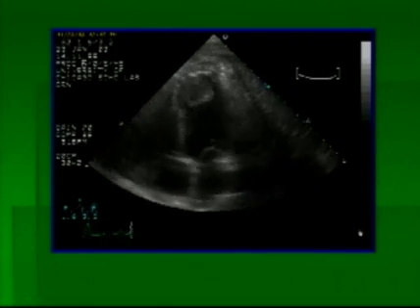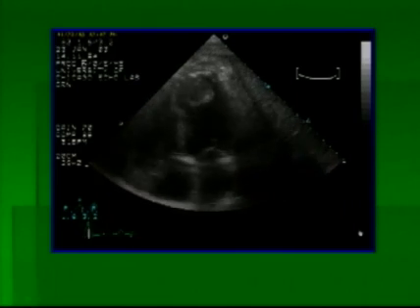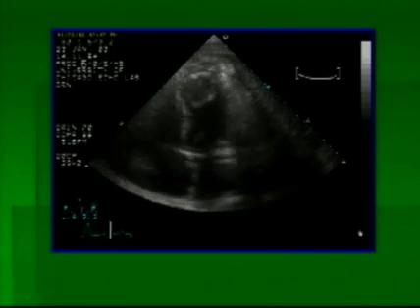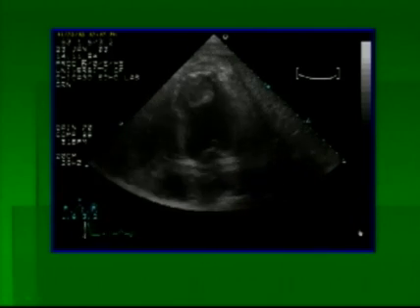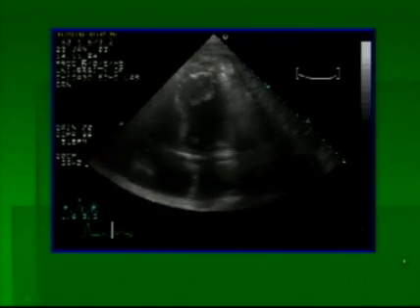So to tell you the way I would look at this, in the left ventricular apex, there is a very large mass. It's accompanied by a wall motion abnormality. In fact, I would characterize it as akinesis of the apex with some brightness in the myocardium and probable thinning. This mass is not terribly well circumscribed, and it is partially mobile, mostly due to the adjacent cardiac motion. I think everybody can pretty much pick that up.